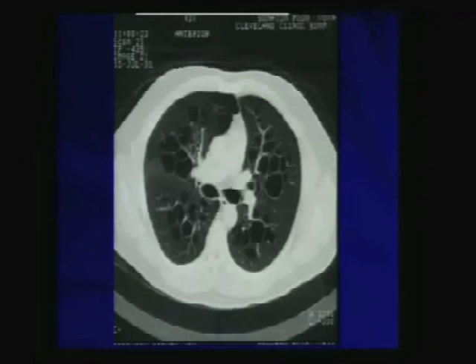Bronchiectasis, exactly. And we tell that it is bronchiectasis by the fact that it does follow the anatomy and the distribution of the bronchi. But when the bronchiectasis is very advanced and you have cystic bronchiectasis, then it can mimic cystic disease. But those are all bronchi. Now we're not talking about within the parenchyma as a secondary pulmonary lobule.